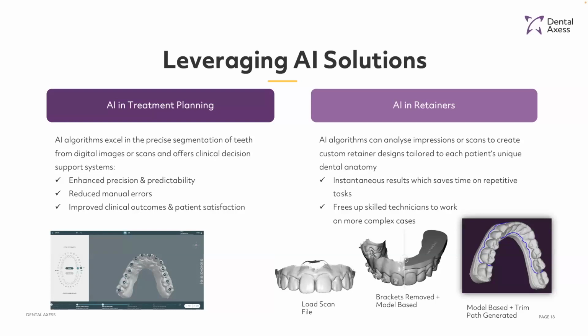There's going to be the ability to put together a default pattern of where you would place attachments and automatically apply that to arches or to treatments as soon as you receive that in from a patient. There will be a new feature that can propose the optimal arch forms or have you shift arch forms and then have the teeth distribute naturally to that.